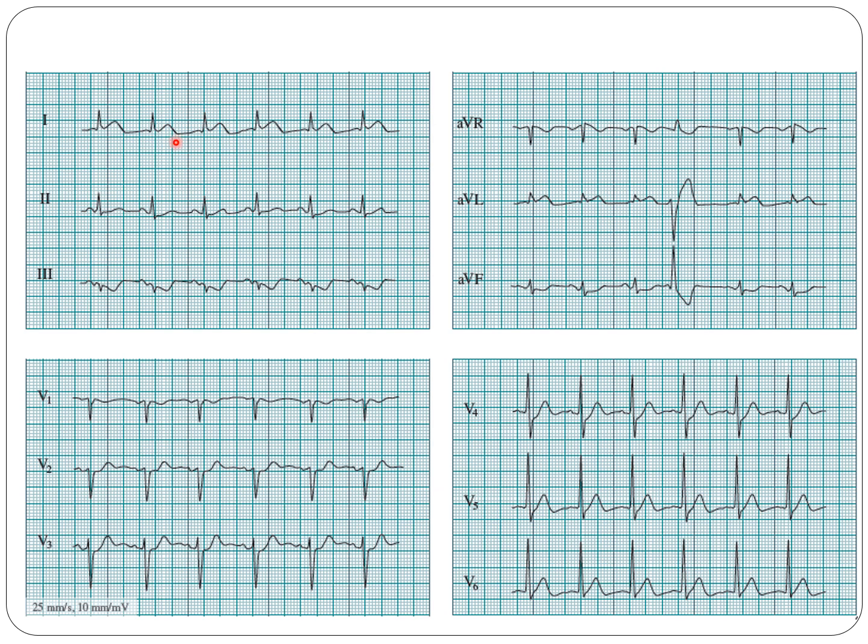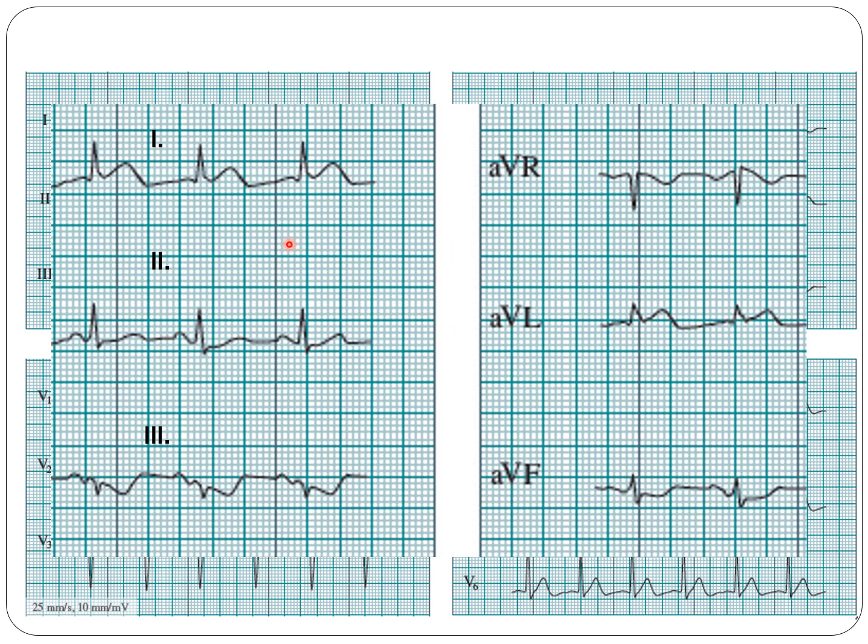Next, rhythmic. Heart rate is around 80. The impulse generated by the sinus node, P morphology is normal, PR is normal, width of the QRS is normal. Lead 1 positive, AVF is a small one, so it's close to 1, maybe around 20 or 10 degrees because AVF is a little bit positive.